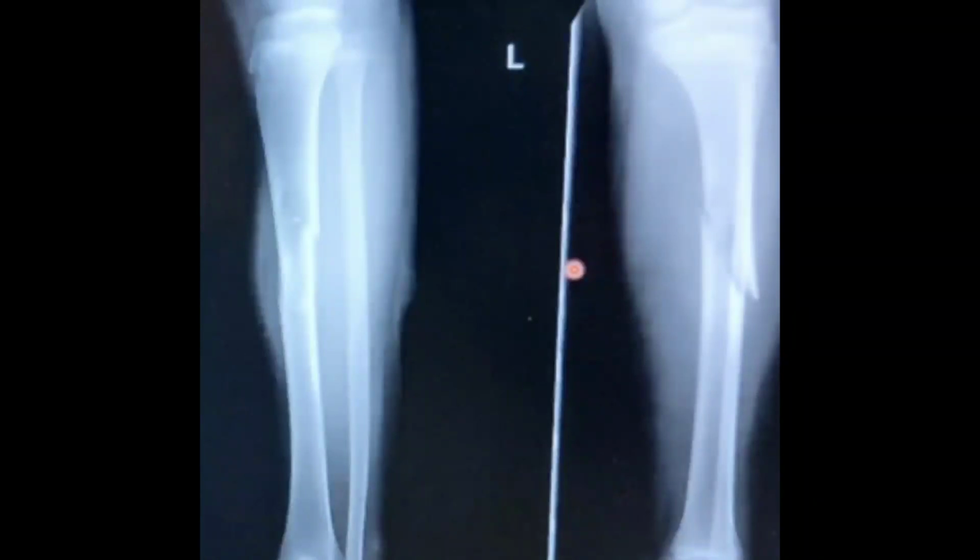So again there is another example, a simple bone cyst with a transverse fracture and a fallen fragment within it. This is intramedullary, ranging from metaphyseal to diaphyseal. The patient is skeletally immature. This is a fracture. Because of the fracture there is a periosteal reaction. Otherwise normally there will be no periosteal reaction unless there is a fracture. So besides the fracture there is another sign, which is called the fallen fragment sign. You can well appreciate it on this image.